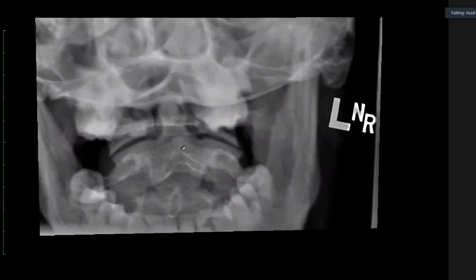Well, do you get that with somebody who falls on their head? Usually you get a dens fracture when somebody falls on their face. But this lady has fallen on her head, so you're thinking about C1 fractures. But if you look at the C1 alignment, the lateral masses are well aligned. There is no splaying, no lateral displacement, and no widening. They're more or less equidistant.